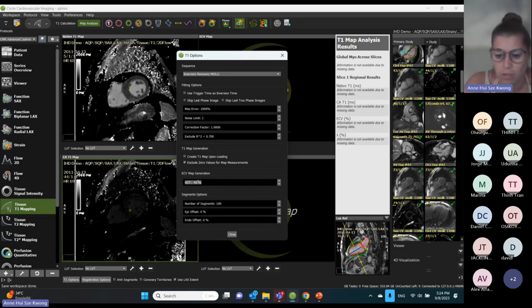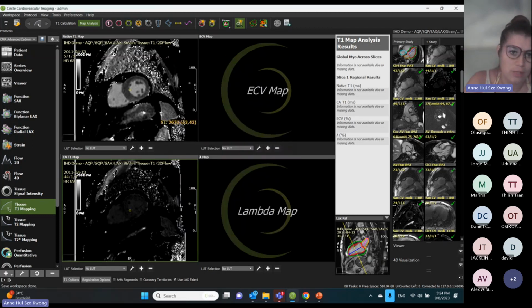So unfortunately, if you don't have the real value, and if, for example, it's 45, the ECV value could be a bit, let's say, not really correct. So this is where you can put the hematocrit. So I was in map analysis directly because I want to use the maps. Okay, I drag my pre and post contrast map. Now I can run the AI.